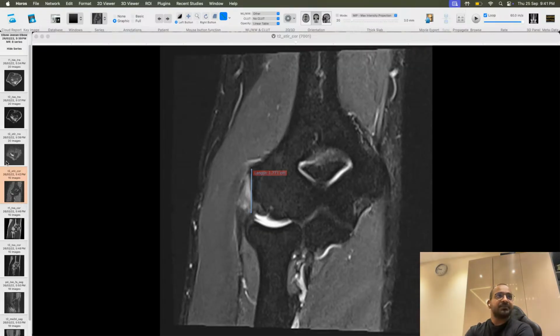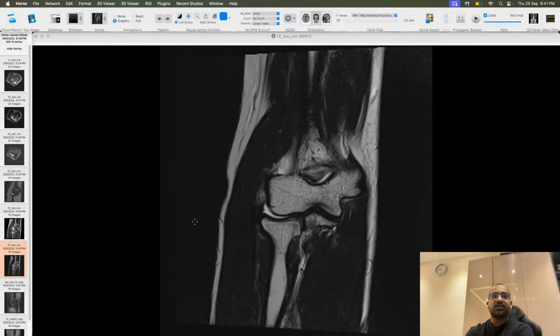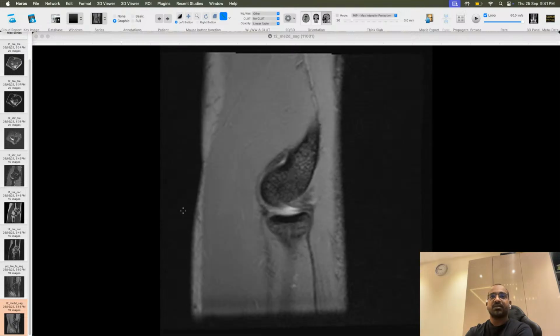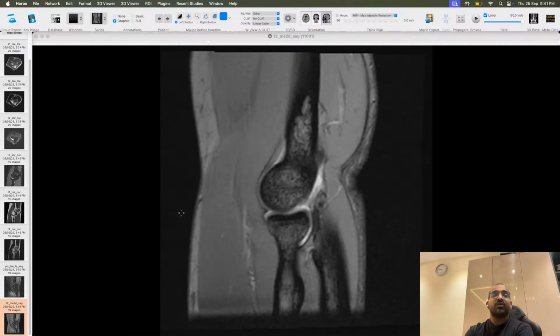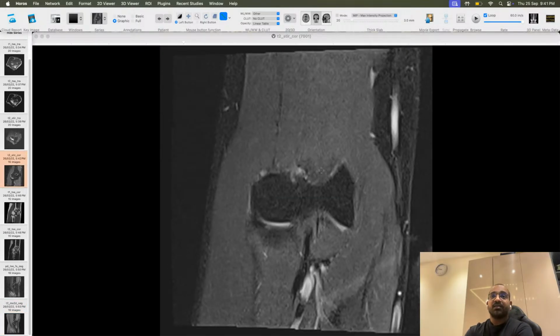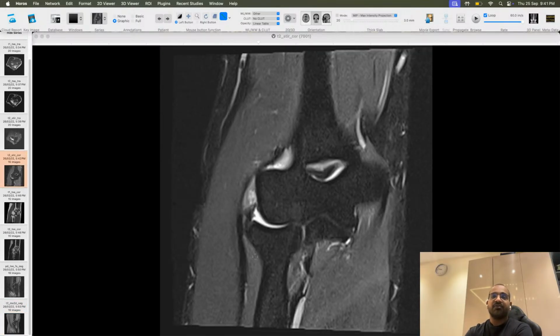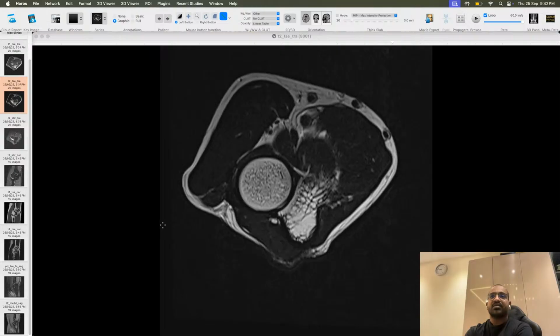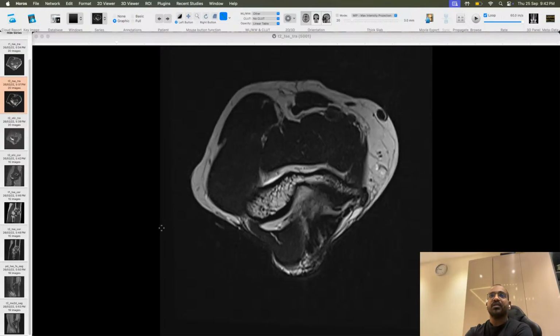What is another ligament? Other than those, there is an annular ligament at the neck of the radius. Unless there is some dislocation or radial neck dislocation, we cannot really appreciate that. Then we look for the neurovascular structures, basically the nerves in the elbow joint.